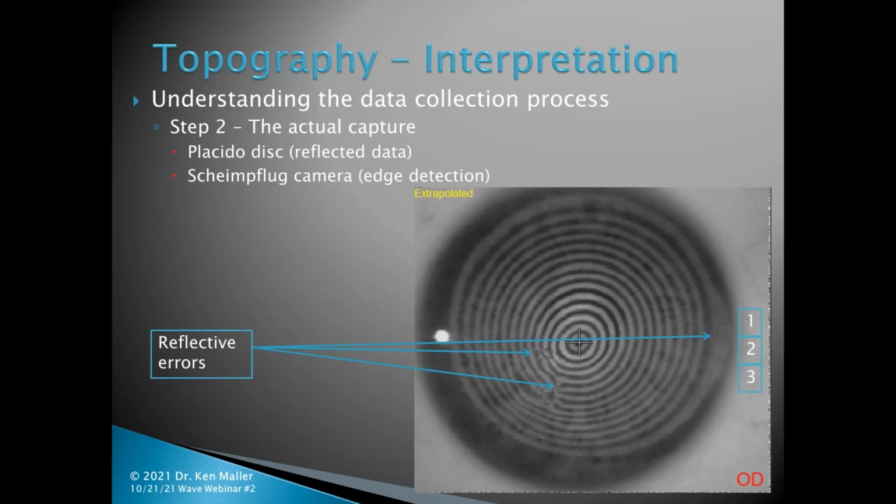Here at number 3, we could see that we have a ring that got pinched over from the inside to the outside ring. Here at number 4, we could see there's a widened band. And at number 5, again, the rings are a little bit crowded over there. And here we have absolutely no measured data whatsoever.